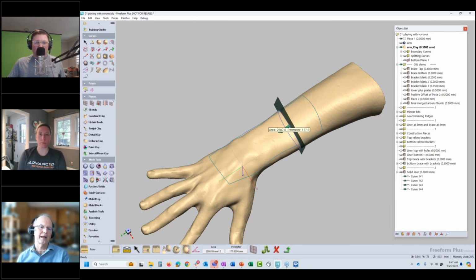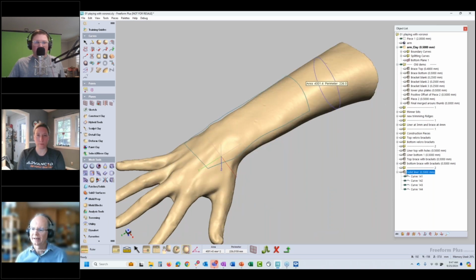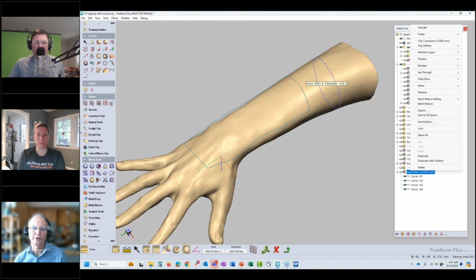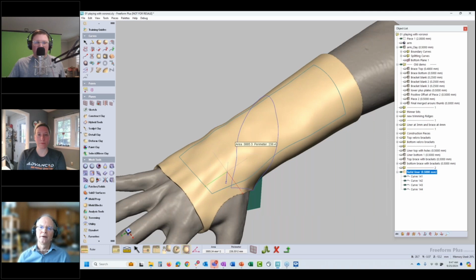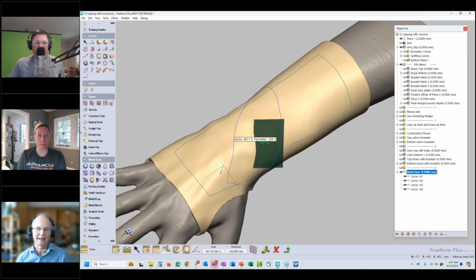And then as you go back and modify the model, you can hit update and you can see the perimeters update. So you're getting those real measurements. But if I go back to my solid liner here, and I'm only showing you a couple of the new tools that are coming. There's a whole bunch of things coming along the way. One of them is Voronoi patterns.